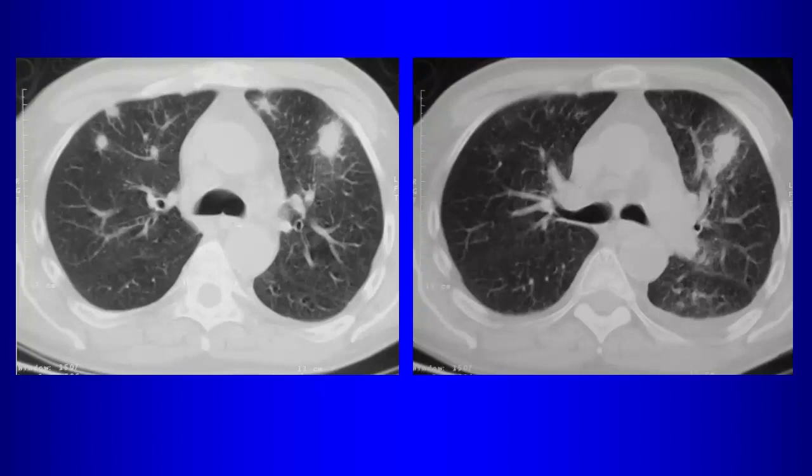What else might give you that appearance of ground glass halos or multiple lesions? Like an adenocarcinoma? Why would it have a ground glass? Well, if it's lung cancer, we know that lung cancers can be associated with ground glass. So metastatic adenocarcinoma from lung cancer can do that, right? But what's another feature of the neoplasm that might give you ground glass around it?